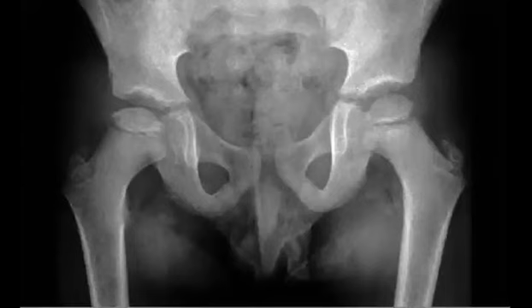Okay. Later, you can find the subchondral lucency and maybe fragmentation, flattening. But the early stage like this one will be difficult, and more difficult if it is bilateral. Then it will be more and more difficult. The treatment sometimes reaches something called osteotomy. Yeah, it can be conservative according to the stage and so on.